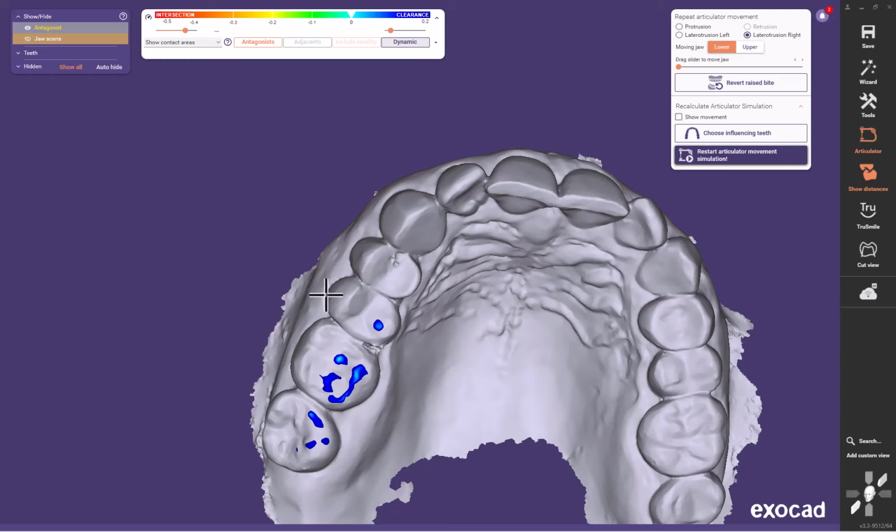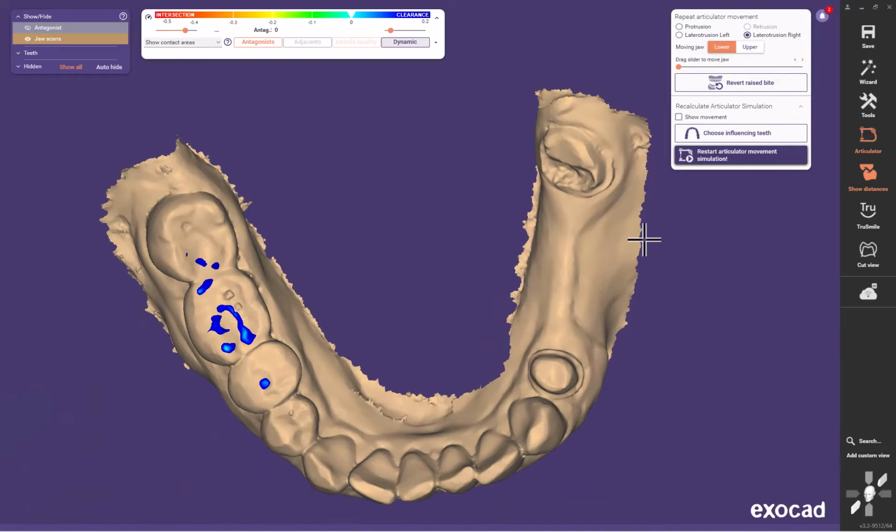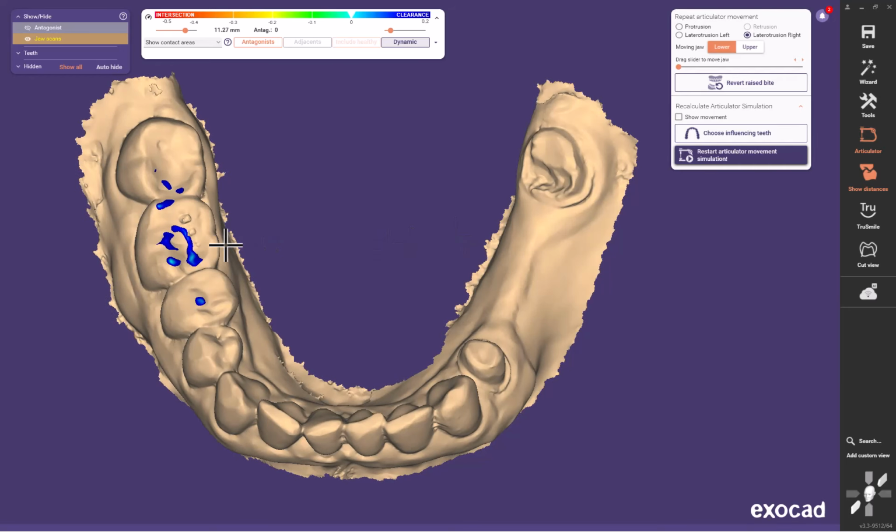Every time you rerun it, you see you're going to pick up more spots. I tend to alternate between the arches just to not excessively remove. I don't like to remove out of fosses, but I want to try to hit the inclines.